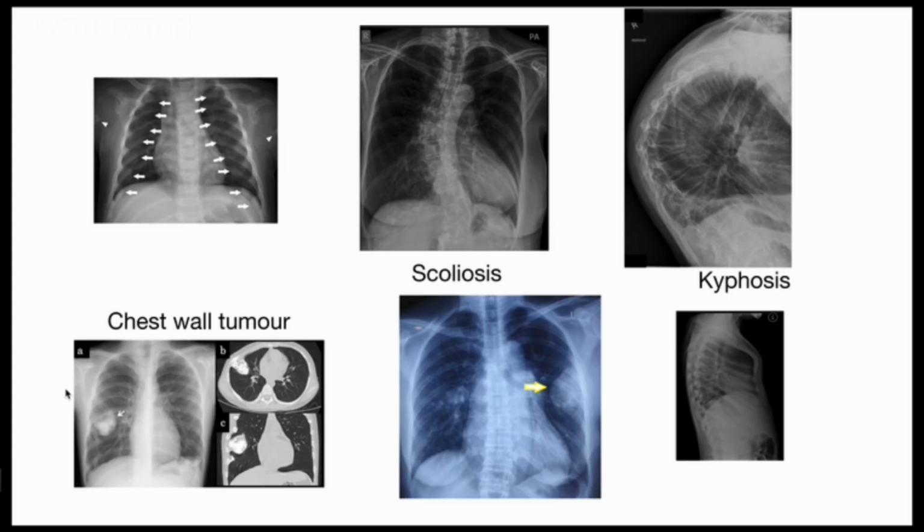The other bony structures like the vertebra can also be evaluated, and here we talk about scoliosis. When we are reporting scoliosis, we can say either it is an acute scoliosis or a smooth scoliosis with the concavity to one side, like you see in this image, it has concavity to the right. On the other side, we can get kyphosis on the lateral aspect, and it can be a sharp or smooth kyphosis. And here also that depicts in the bone structures.